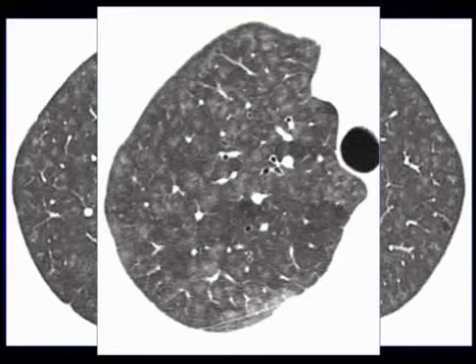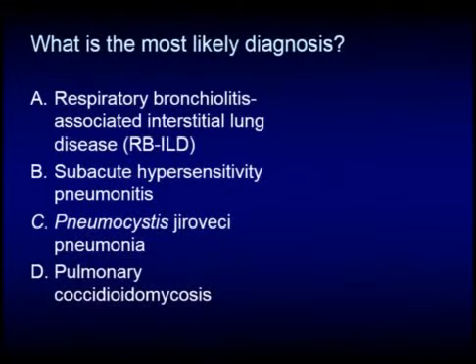So this takes us into that inhalational category and that more diffuse involvement that we call a pure centrilobular pattern. And of the two choices, the reason why subacute hypersensitivity pneumonitis is probably more correct here is because in that brief one-liner we did say a non-smoker. Certainly RB-ILD, which occasionally tends to be a little bit more patchy, would be expected in a smoker, whereas subacute HP would be in a non-smoker, as in this case.